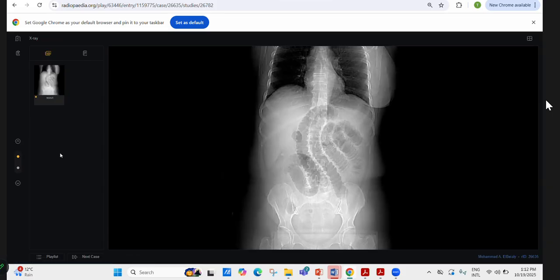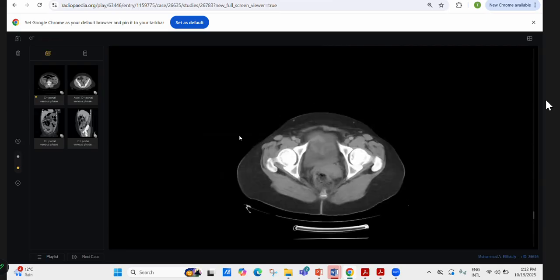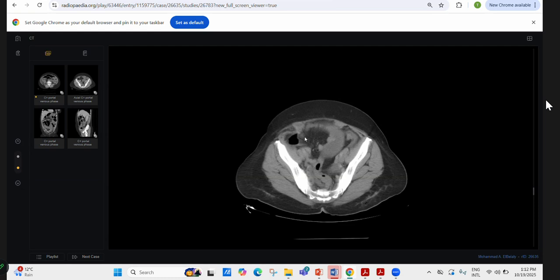Okay, yeah, you did really well. You reached it by looking at the coronal images, to the hernia, an anterior abdominal wall hernia. But the name of it is, anyone knows the name? Spigelian hernia. Is it Richter's hernia? No, Spigelian hernia. Yeah. So it's a defect between the external oblique and transversus abdominis muscle, and then it caused the mechanical obstruction, and then you straight away refer the patient to the emergency surgical department.